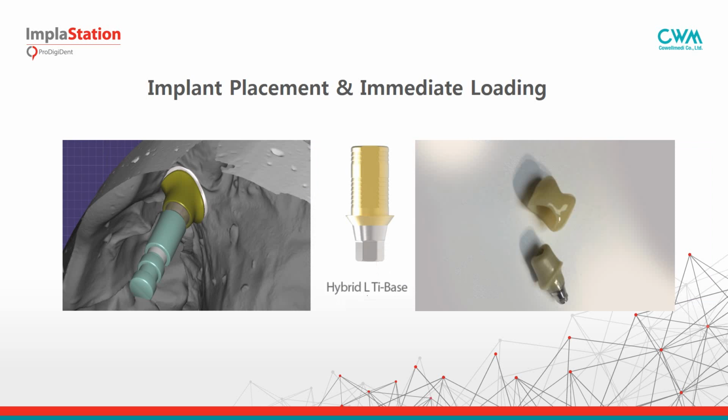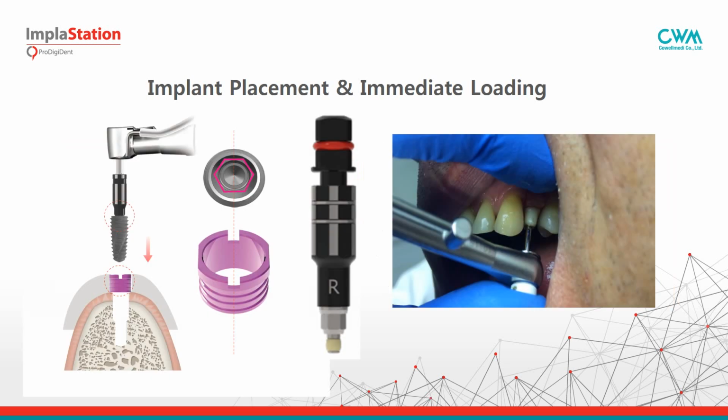This way the technician has received all necessary information about the gingival part of the abutment. Crown reduction gives information about the supragingival part of the abutment and its ledge. So this is how to prepare the abutment and provisional crown before surgery, together with a surgical guide.